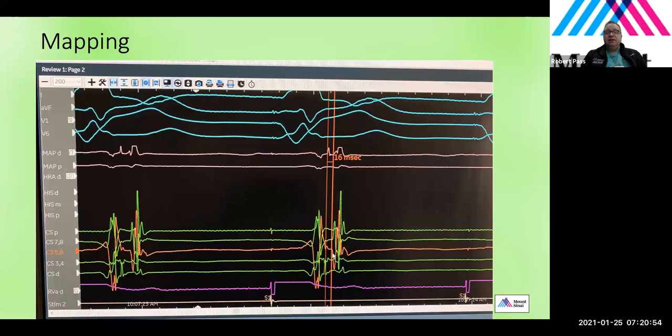The reason being that the patient was not very pre-excited. And I thought that it was easier to see the retrograde atrial electrograms than it was to see the antegrade ventricular electrograms. And I wanted it to be as easy for Josie and our tech from Carto, Kelvin, to be able to see the retrograde A's more clearly. So Josie and Kelvin were using this atrial electrogram.